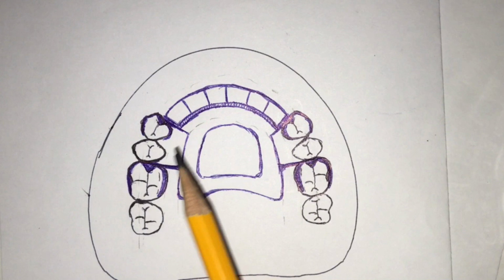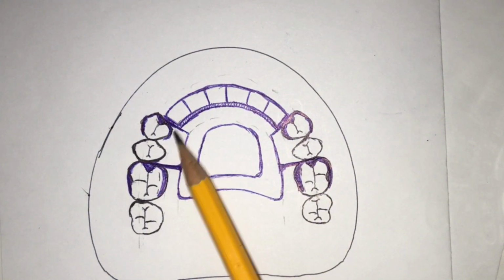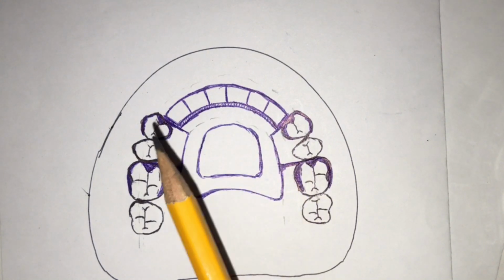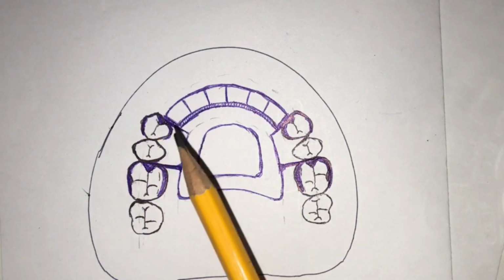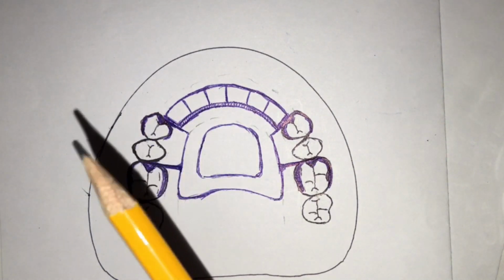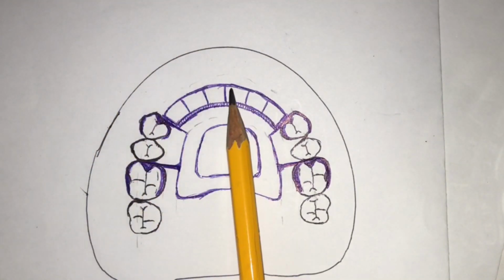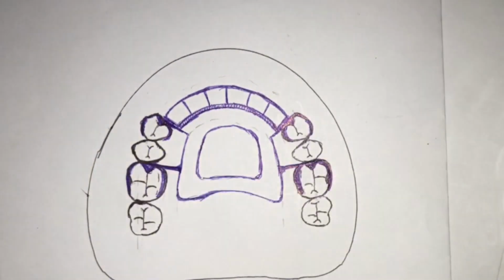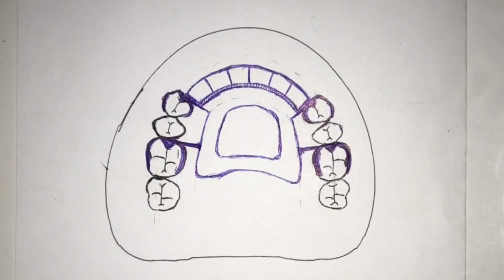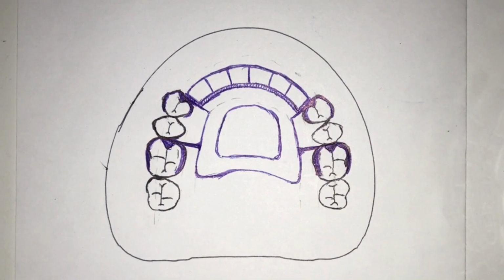How about, ma'am, if we just use the most posterior abutment? We do not place anything here. As in, you do not place anything. For example, you're just going to place your gridwork. No proximal plates, no whatever. Again, it will tend to rotate going here. So it will rotate backwards. That's why you need to distribute the load evenly into 4 abutment teeth.